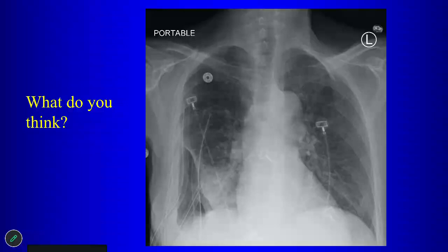So that causes the lung to collapse because the pleural fluid takes up the space. Then you put in a chest tube. You take out the fluid, the lung should re-expand to fill up that space again, right? That has not happened here, correct? So we think about trapped lung. But what is it that causes the lung to be trapped? Why doesn't the lung re-expand? The visceral and parietal pleura are connected. What's thickened? Is it the parietal pleural thickening that prevents the lung from expanding?